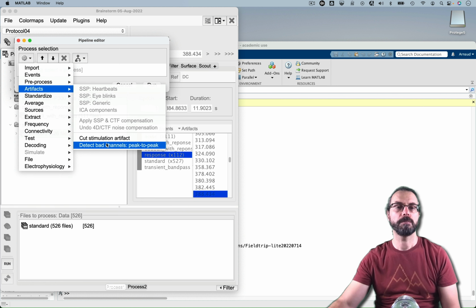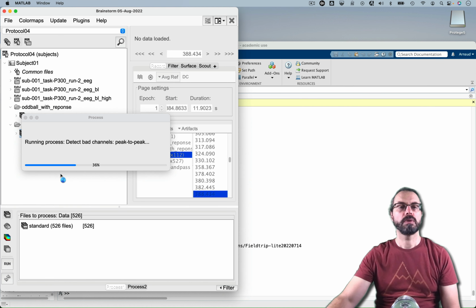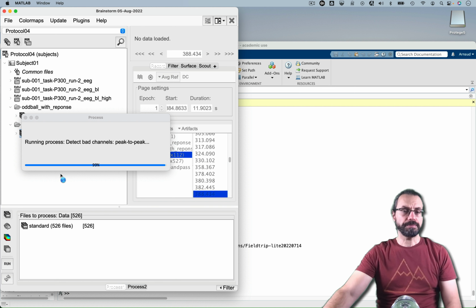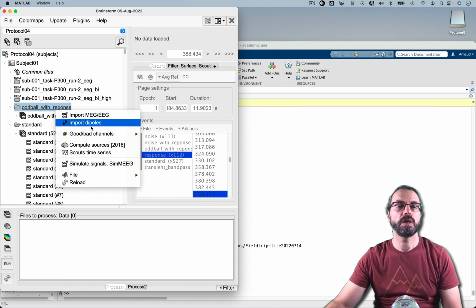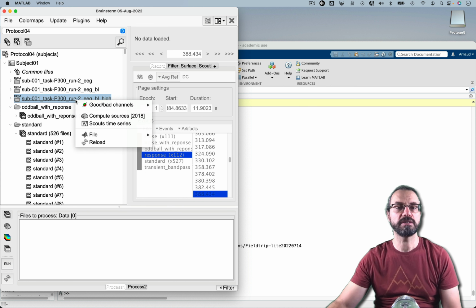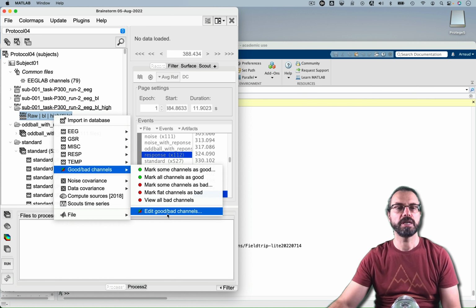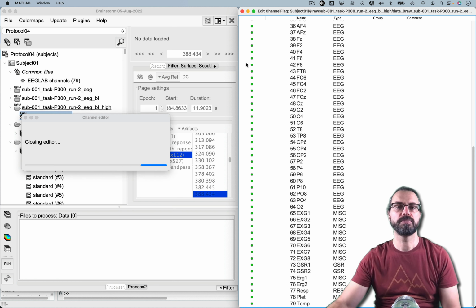Artifact, peak to peak. And then we're going to create some average and plot the average. We can also mark the bad channels, which I usually do at that stage. Here, good bad channel, edit good bad channels, and then, for example, you can mark all of these. If you don't want to use them, you can mark them as bad. And I'm going to do that in the script as well.